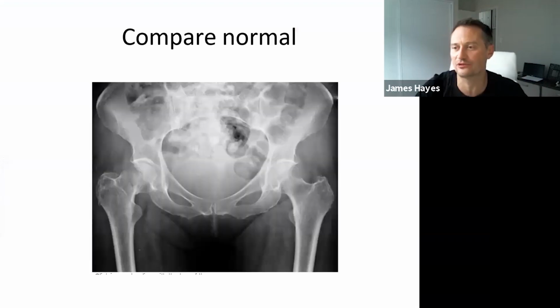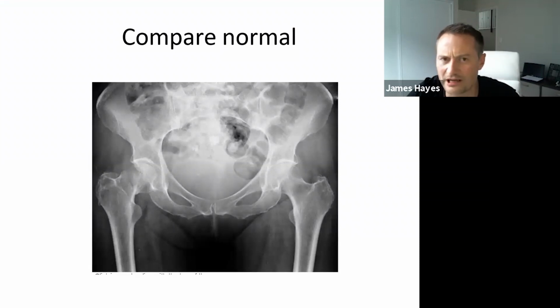Okay, and again, I've mentioned compare two sides if possible. Now, you won't always get the two sides, like both shoulders. You'd never really do that unless there was a real necessity. And this is important in pediatrics because of the growth plates and bone age. Sometimes, although we have rough guidelines for what a child will have grown to by that age, we're not quite sure. But if it's the same as the other side, we're more sure that it's normal development for that child.